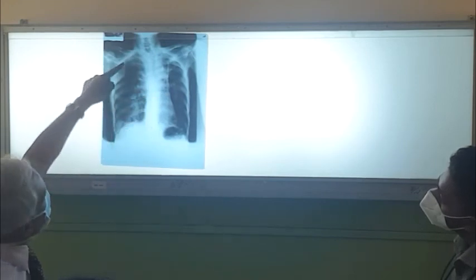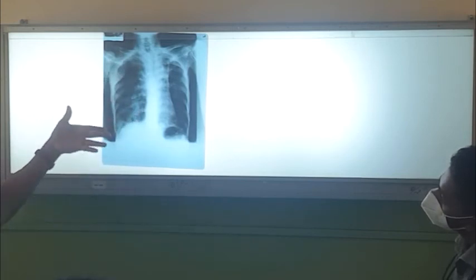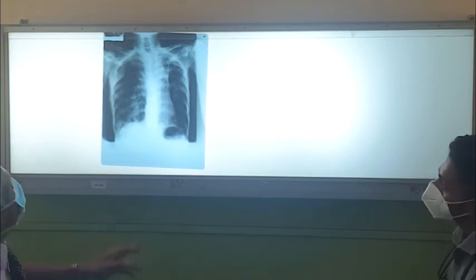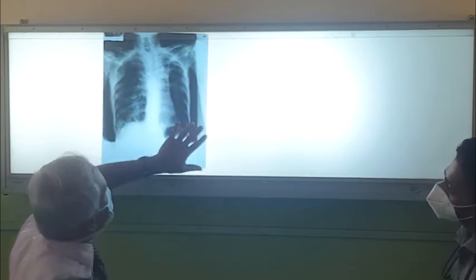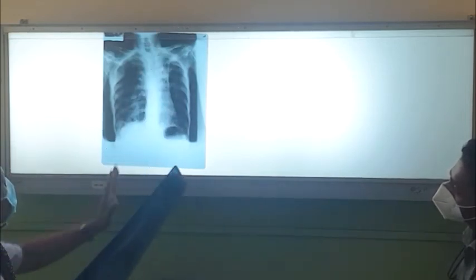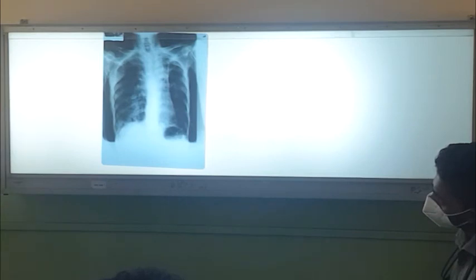Then you can see overlapped scapulae, and the patient is getting oxygen. So it's an ill patient. Scapulae are overlapped, so that means we have taken an AP film. Then you can see the skin here. No soft tissues there. So it's a severely wasted patient. No soft tissues, right? Then these are all TB, and the cardiac shadow is shifted here. Vessels gone down. That is because of the TB, with some fibrosis in the left upper division.